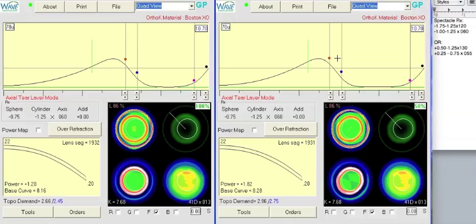By simply shortening the treatment zone, we actually are pretty close to target. But I'm going to bump that up a little bit at the red dot, as close to 1.95 as possible. And then the same thing on the other side because we're in free form, and it's already pretty close there. So now we have an additional 0.75 diopters of power in this meridian, creating hopefully or ideally a cornea with 3/4 of a diopter of toricity that is in exact opposite orientation to the lenticular astigmatism.